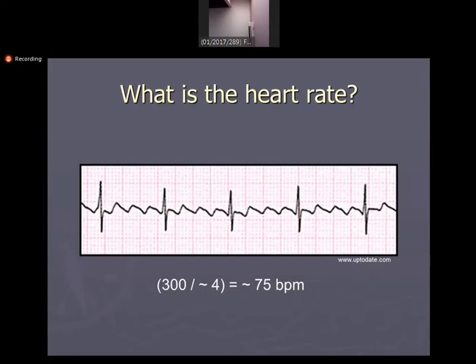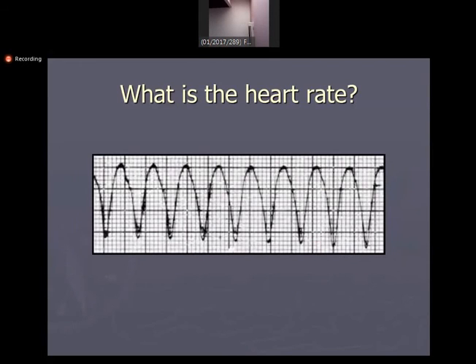This is a rhythm which is called a dying rhythm. Sometimes there is electrical activity but no pulse, or it may be a ventricular tachycardia. I will tell you later on if we have some time to understand.